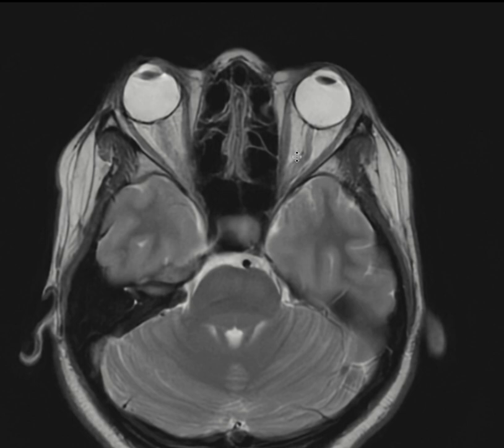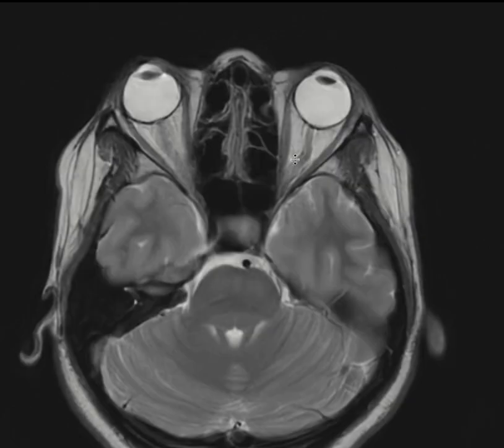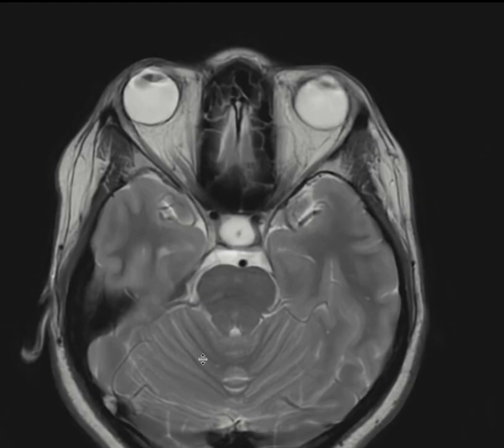nerve. We see these are a little bit kinking, and also the CSF space around them looks a little bit more prominent. So these are all signs of intracranial hypertension because of all this CSF, bulging, papilledema, and all the findings related to the orbits.